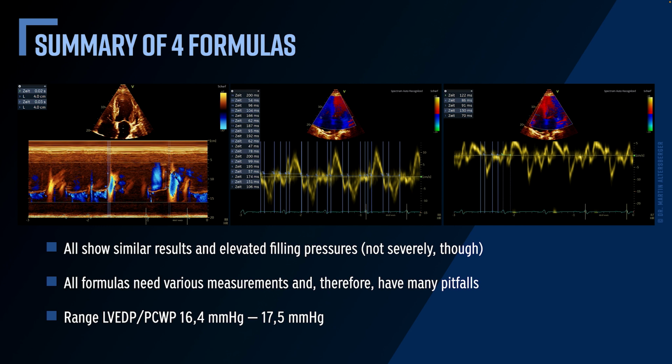Overall, we already started therapy. So there might already be a reduction in filling pressures present compared to how the patient initially presented to us. All of them show a similar result, but not a result I would have thought we would see.